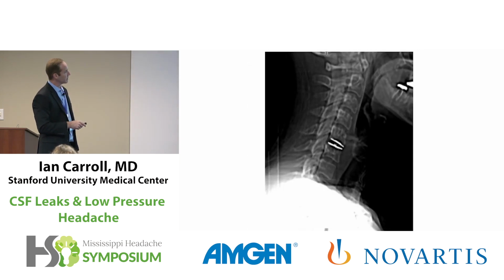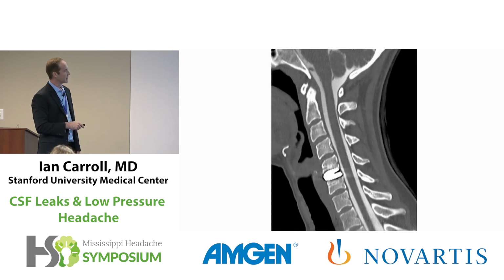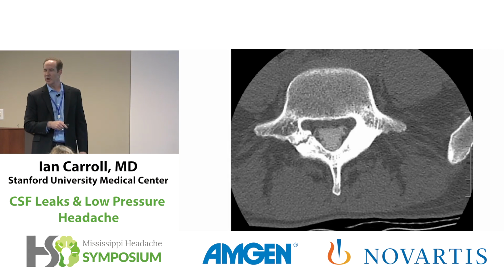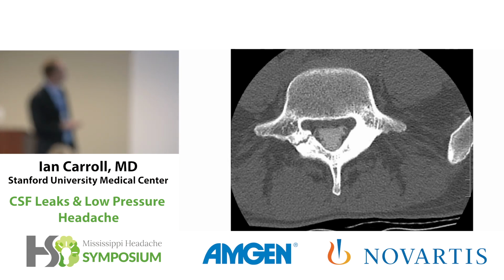So that's what the disc replacement looks like on the X-ray. That's what it looks like on a myelogram. Now suddenly nothing's really pressing on the thecal sac there. And in fact, if you look at the axials, there's no spread of contrast out along the nerve roots. It looks pretty reassuring where the surgery was. On the other hand, down at L5-S1, where I showed you that teeny little line, on the myelogram, clear as day, you can see that she has a lamina fracture. Somehow or other, she managed to break her lamina, and the edge of the fracture comes right up to the CSF-surrounded nerve root here on the right-hand side, right?